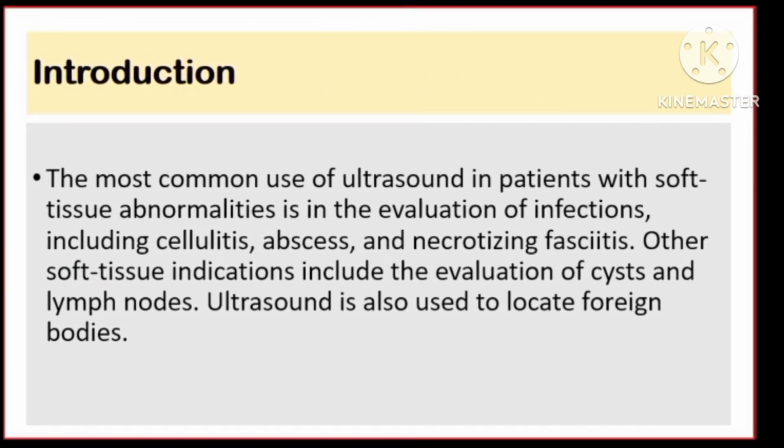The most common use of ultrasound in patients with soft tissue abnormalities is in the evaluation of infections, including cellulitis, abscess, and necrotizing fasciitis. Other soft tissue indications include the evaluation of cysts and lymph nodes. Ultrasound is also used to locate foreign bodies.